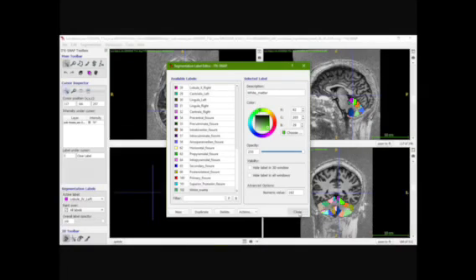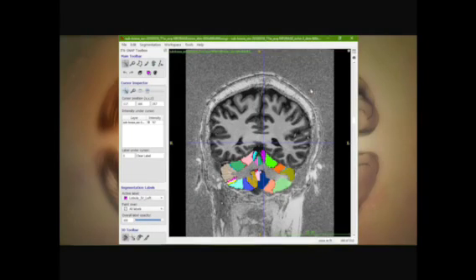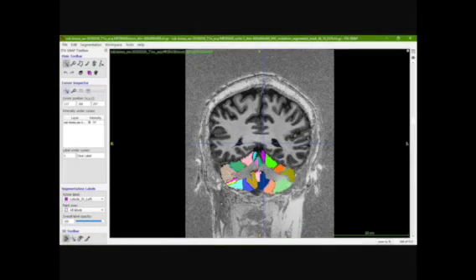Now you can go ahead and close it, and I am going to open here the coronal view. You just click on this part. If you want to extend the sagittal view, you can click on this part, and if you want to see the horizontal view, you can click on this part of the screen. So I am going to open the coronal view, and as you can see, that extends my coronal view. Right now I am going to show you the different features that are in the main toolbar. Here you can see that there is a zoom button.